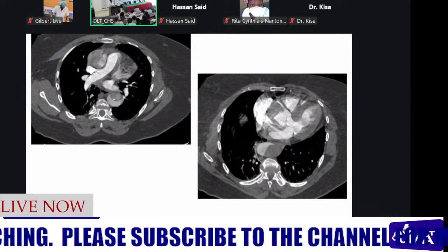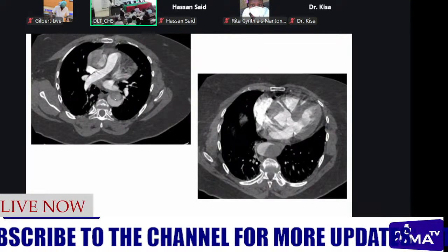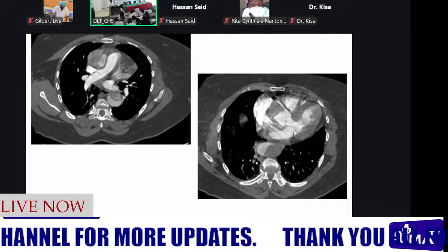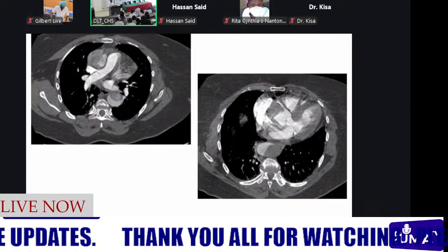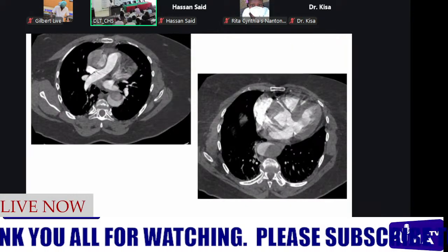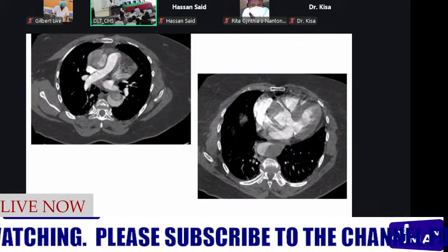In the descending aorta, still we are able to appreciate the true lumen, which is surrounded by the false lumen. Then here, we are at the level of the aortic root, still our axial view. We are able to appreciate the descending aorta having the 2 densities. Though here, what I wanted to show us is at the level of the sinus of Valsalva.